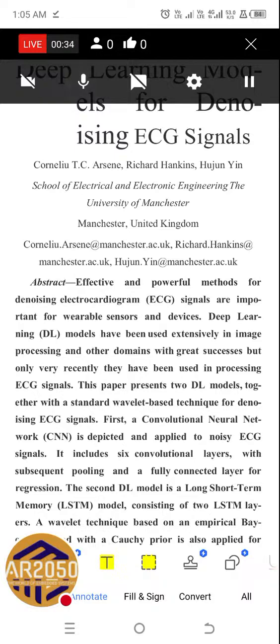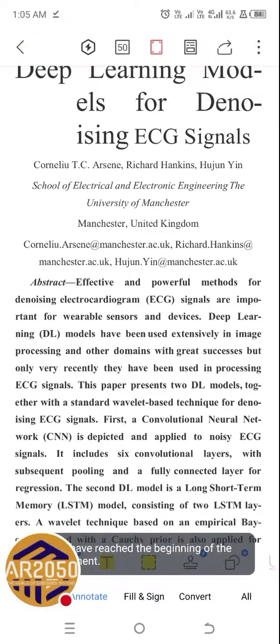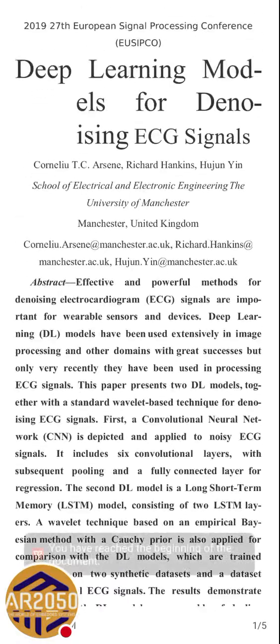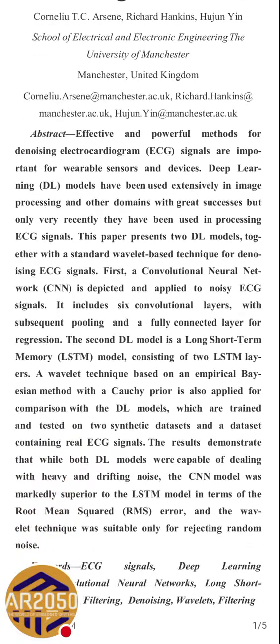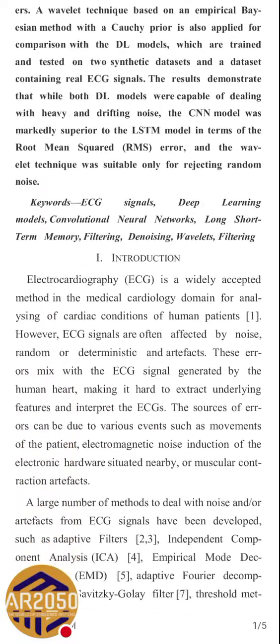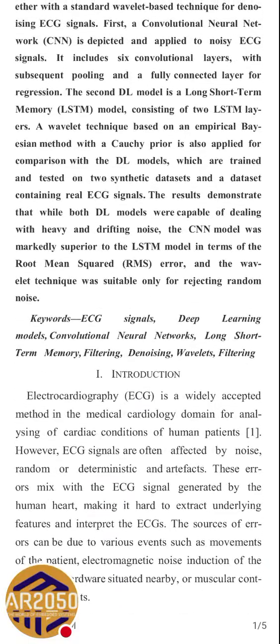Okay, so in today's video, I'm touching the topic of sequence to sequence models. And for that task, I think exploring denoising would be a better approach. And there are a bunch of models. The first problem we can keep up with is ECG denoising. Because we have been doing a lot of videos related to ECG signals, I thought it would be better to go along with the ECGs before diving into some other problem.